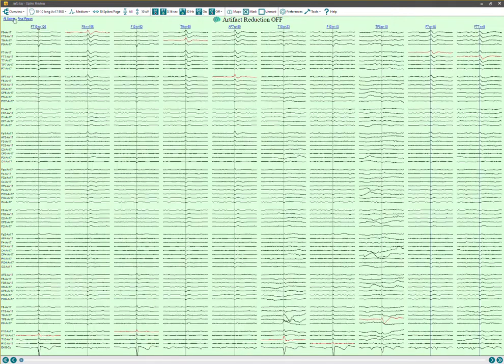So we'll go back to the overview. I can skip that. And I've got some other ones that are the same way. So I'm going to turn my attention to the ones that do not have an EKG averaged in and lining up perfectly. So let's go ahead and click on this next group.